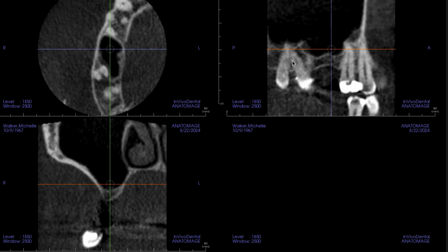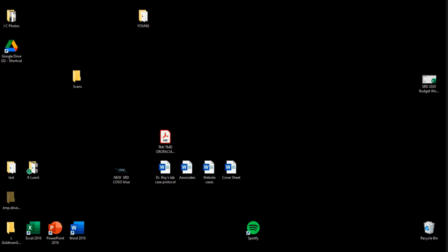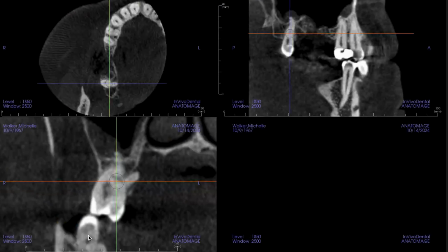So it's very possible that this communication was non-contributory until the tooth came out. Tooth came out, bacteria traveled in, and then set up shop in the PDL in an area where the anaerobes were probably likely to thrive. Because if we look at the post-op image, we definitely have some reaction there.